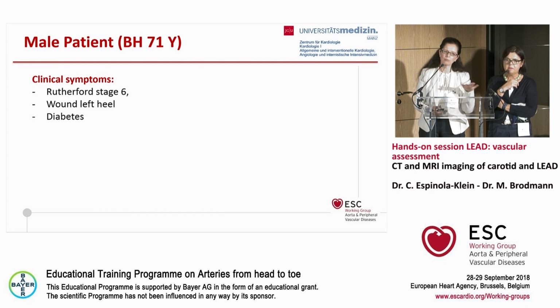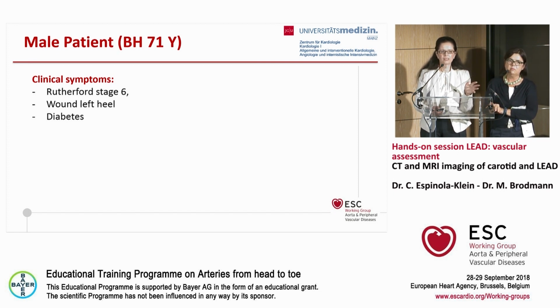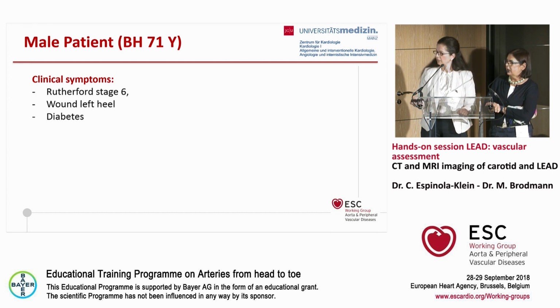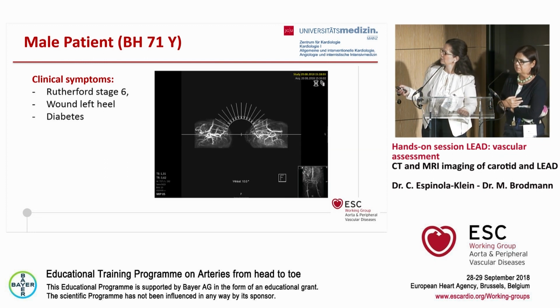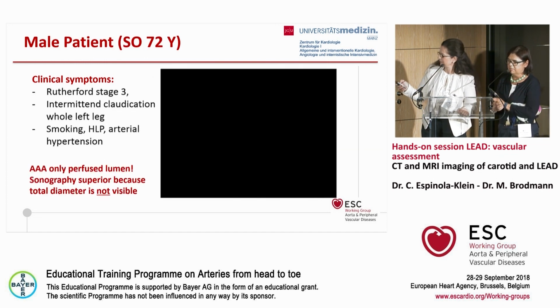All images I have brought to you are from a different outpatient radiology practice. And they have had to learn it, because we have to tell them what we want to see. Now they make, I think, very nice images. So maybe we discuss the next case. So I brought you... What have you done?